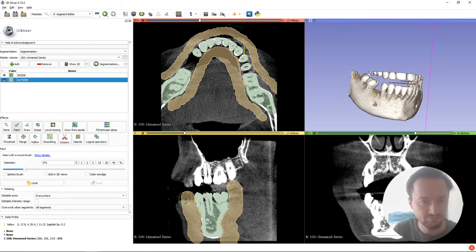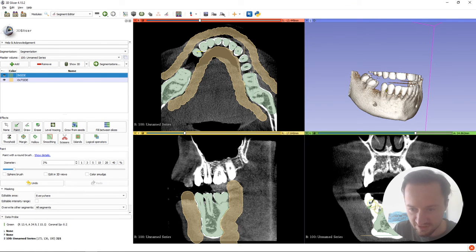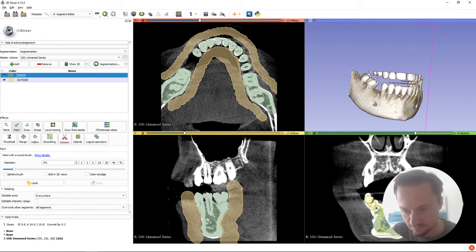And there you have it. Let's go inside again. We're still on paint. I'll stick to the big brush so I can do some nice big definition. Switch to 3. Now let's switch to 1.